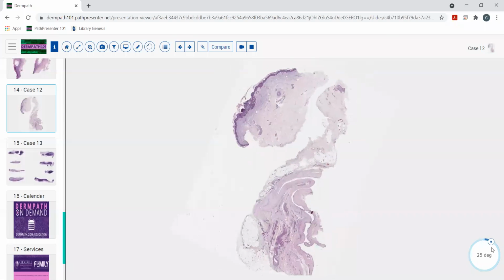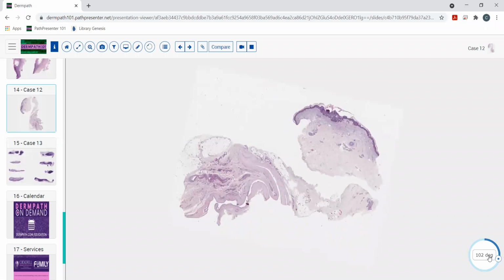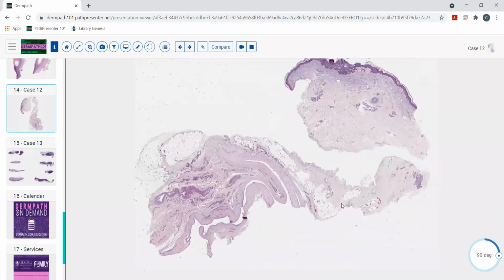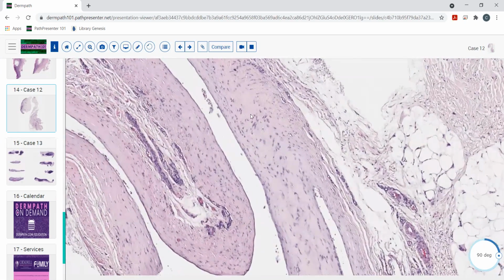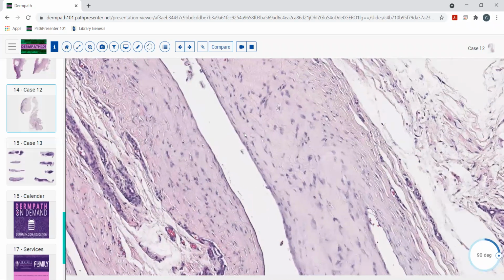Now here's another example of a lesion that, again, is probably not a true cyst. So let me get it straight for you here. Notice here's the epidermis, the dermis, the subcutaneous fat, and way deep to that we're looking way down in the area beneath the subcutis, so we're down in the deep subcutaneous fat tissue. And here we've got this proliferation again of these fibroblasts with this thick collagen. There's a lining. Again, this is not really epithelium.